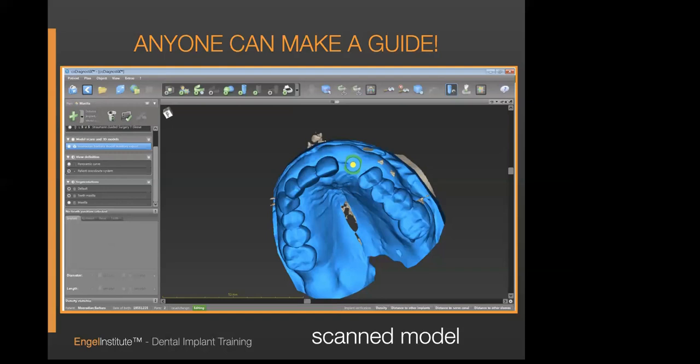Let's look at this case right here. Teeth number 10 and 11 missing. Now there's a couple things that I want you to understand. Implants should go under teeth, period. Implants shouldn't be in between where teeth should be. The only time that positioning of implants could wax and wane a little bit is if you're certain that you're going to an overdenture and the patient's never going to change their mind. Because there is nothing good about having an implant in between two teeth, period.